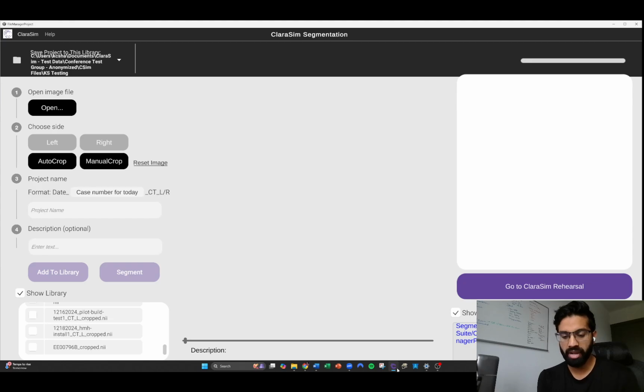We are enabling medical professionals to interact with their patient imaging in a much more interactive and clinically meaningful way. So what we're going to do today is walk through one key use case that this is particularly valuable for. We're going to look at a patient that needs a cochlear implant, went in to see an ENT surgeon, and we're going to see how the surgeon would prepare for their case using something like this.